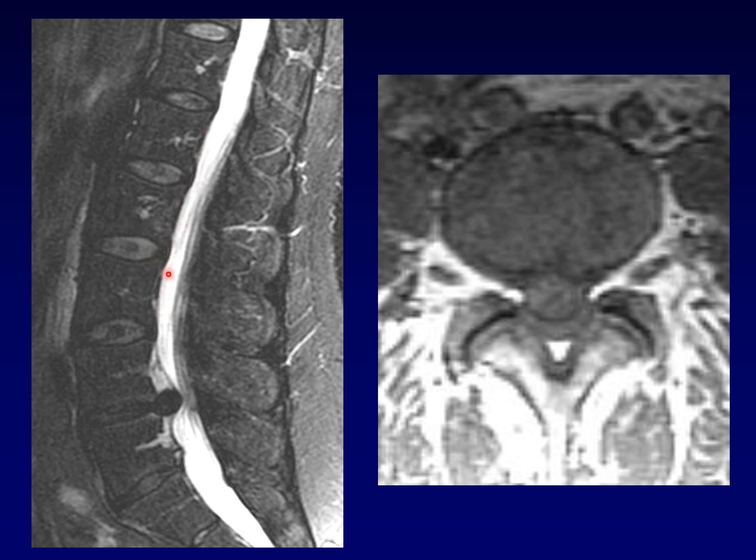Well, in this patient, it's nice and smooth until it gets to about here, and then it bulges out and around this little ball of tissue. That little ball of tissue came off of this disc, and that is a disc herniation. It is severely narrowing the central canal and crushing these nerves in the cauda equina. You can see on this axial T1 weighted image, this is the herniated disc taking up all the space that should be available to the cauda equina within the central canal.